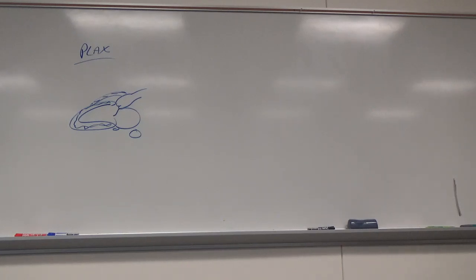Valves. I want to know, what do I want to know about a valve? Open or close? Is it opening and closing properly? So the opening is important and the closing is important. There are things that are going to affect that. So we want to look at two valves in this image for that. What else do we want to see?